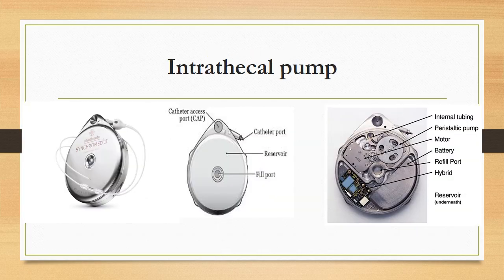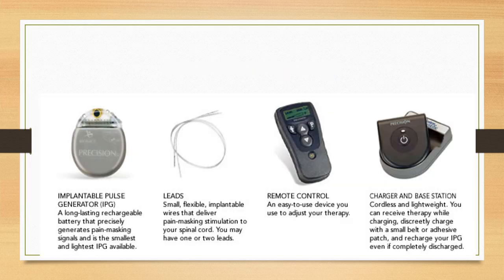Intrathecal pumps. Various drugs are used intrathecally; ziconotide, baclofen, and morphine are FDA approved drugs. The various parts are the catheter port, the reservoir, and this is the filling port where we have to fill the drug. Spinal cord stimulator consists of a pulse generator, leads, remote control, and charger base station.